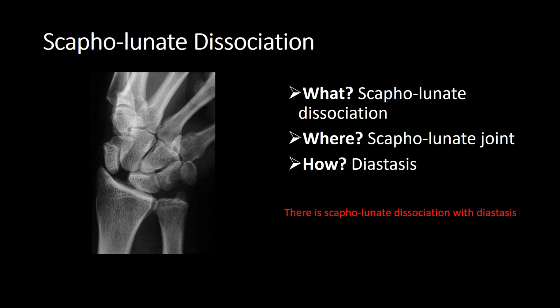So what is it? It's scapholunate dissociation, where the scapholunate joint has diastasis.